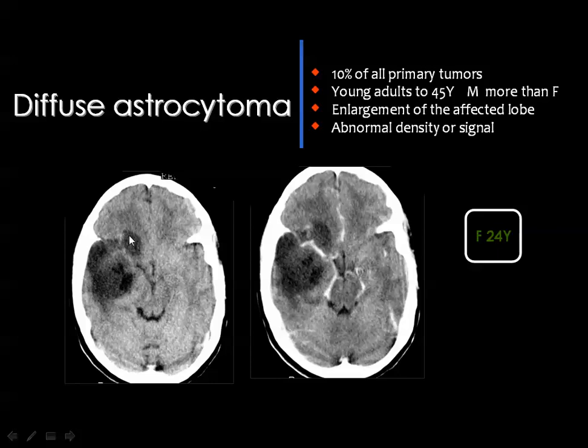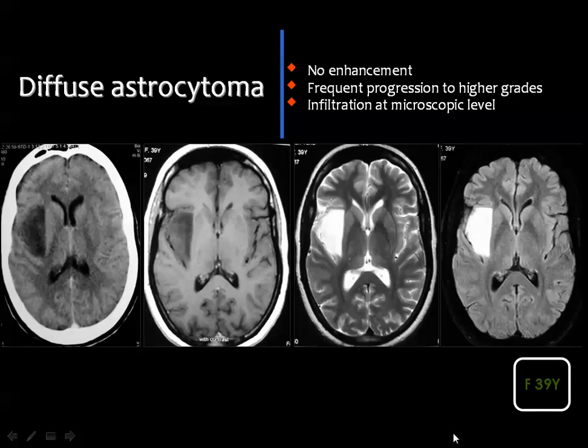Frequently, these tumors are mistaken for infarction, but you should know that infarction is not a space-occupying lesion. Infarction should have a vascular territory on the surface of the brain, and if you inject the contrast media, you will not see the vessel because the vessel is occluded, and you will see gyral pattern of enhancement, as you remember from the lecture of the cerebrovascular stroke.